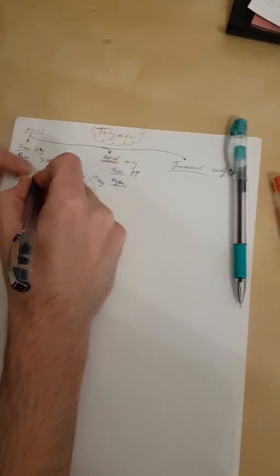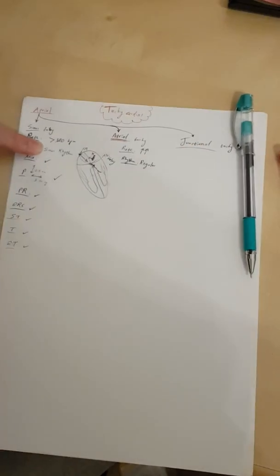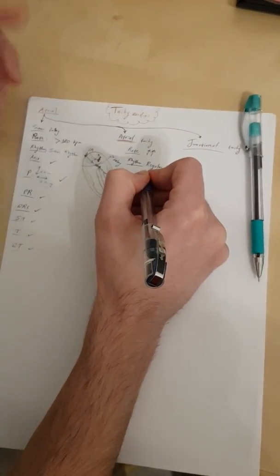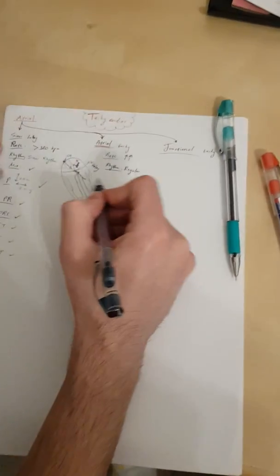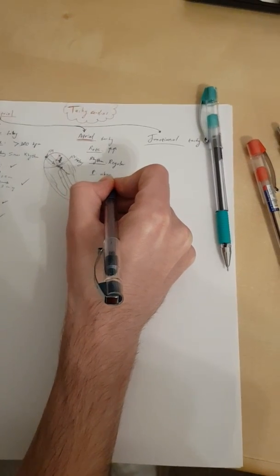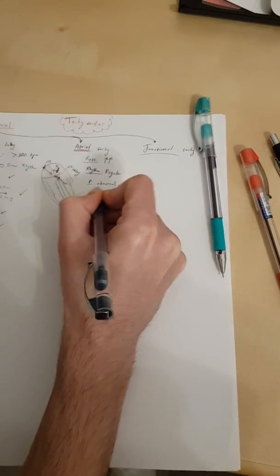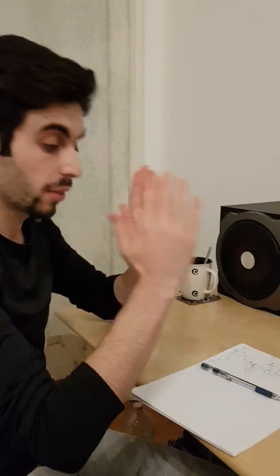is not sinus, but you only stop at the word regular. If it is regular. If it's not, then you say it's irregular. You just measure the RR, but there's no rule for it. Axis doesn't matter. Now P wave is abnormal. Now this doesn't mean necessarily that it's prolonged or shortened or high amplitude, low amplitude. It's just different. You might see in one ECG some normal P waves and then abnormal P waves, a series of abnormal P waves. Then you would know.